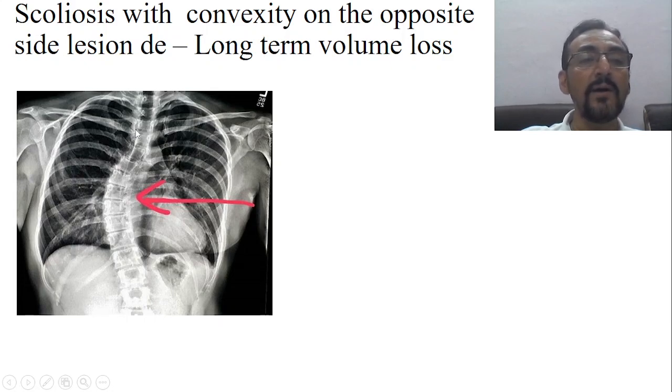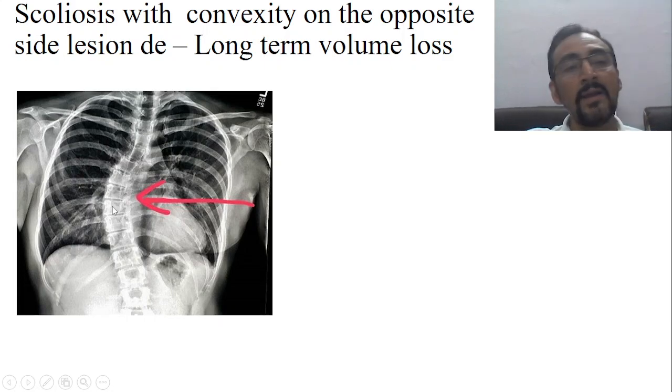See, the medial head of the clavicle in the right side is present over here and in the left side it is present at a far distance. So this is what you say, positioning is not correct. This positioning is not correct not because of a technical problem, but because of a pathological problem. Because of the pathological problem the spine itself has become crooked and because of this it is not equidistant. So on this side, the right side, it is more tilted. That is because the lesion is present on the right side and therefore it is pulling it as shown in the arrow mark.